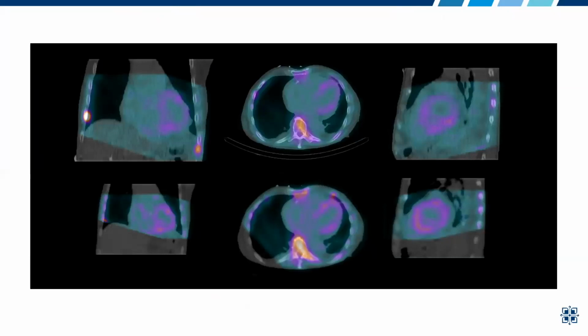we in our lab are not really focusing on the planar images or the ratios, and we're really de-emphasizing that and emphasizing the SPECT images. And here's what we have for this gentleman's SPECT. You can clearly see myocardial uptake counts in this gentleman. And again, we're having what looks like lower myocardial counts compared to what we normally see on these studies.